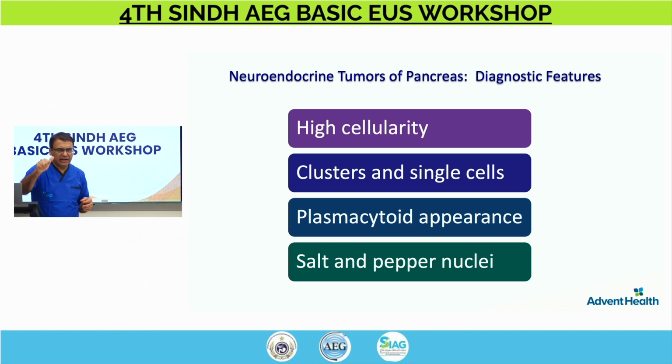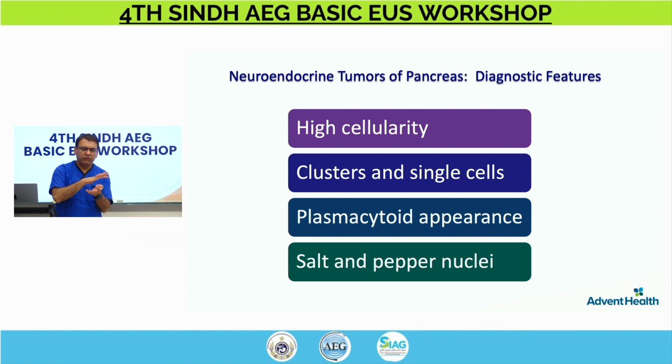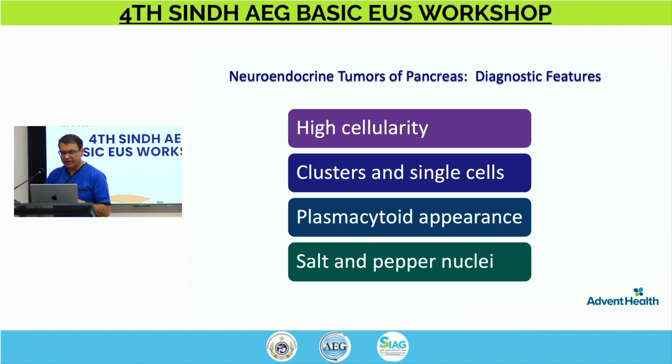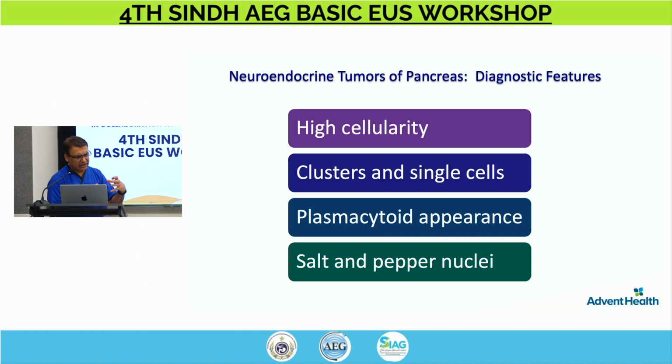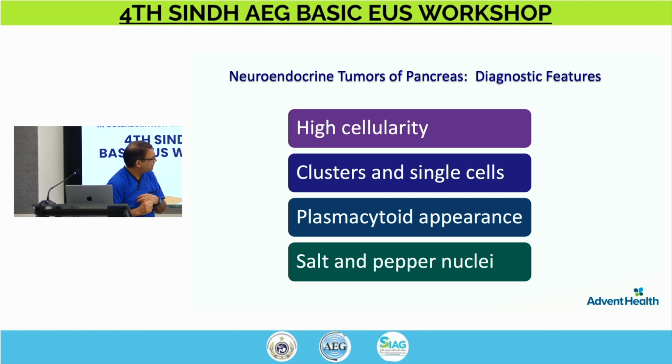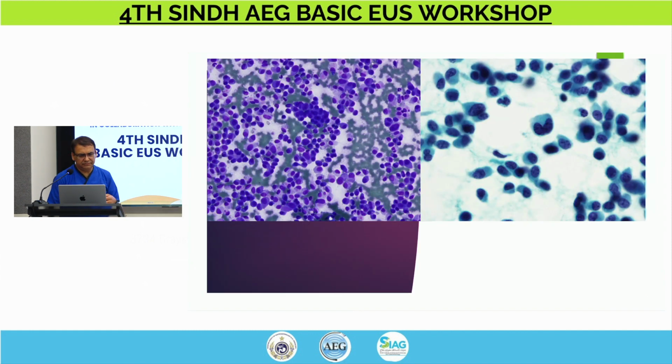Small cell cancer can look like that, and lymphoma. With lymphoma, you will just see sheets of individual blue cells. Okay. And with the neuroendocrine tumor, we'll talk a little bit more. Actually, there are features on there. I'll show you some.